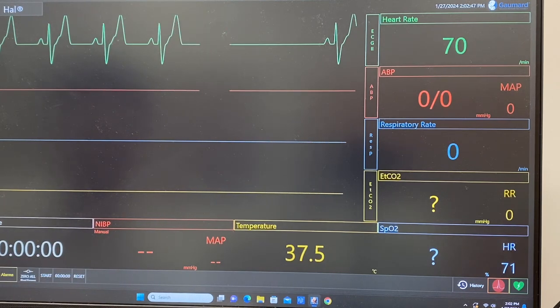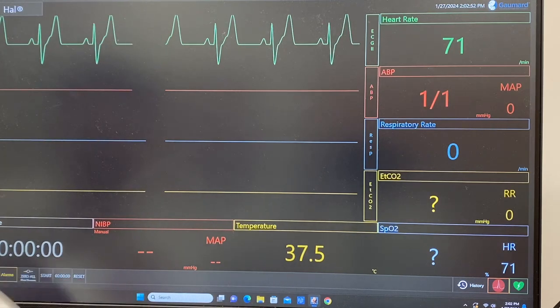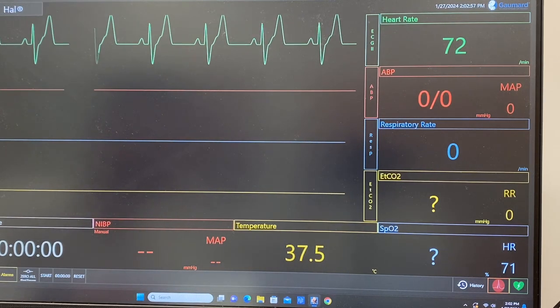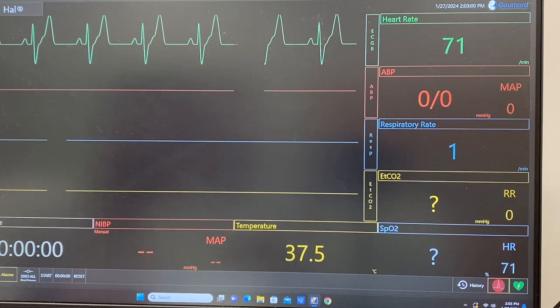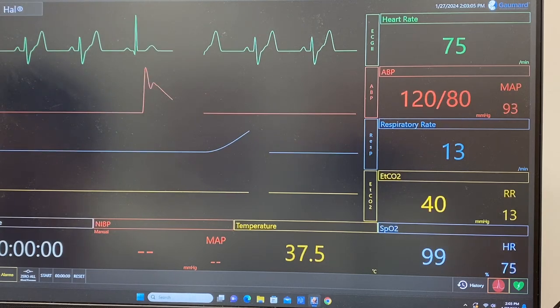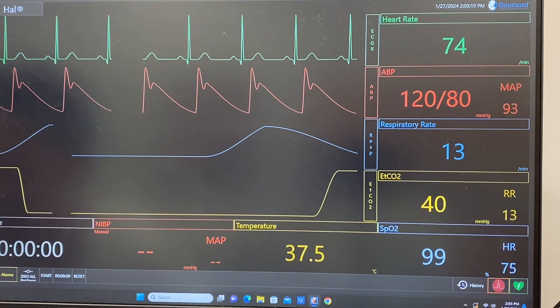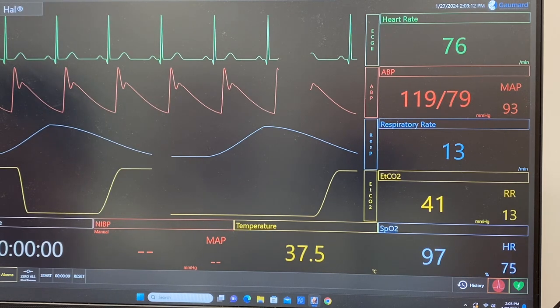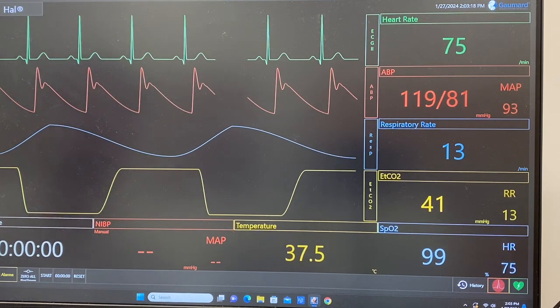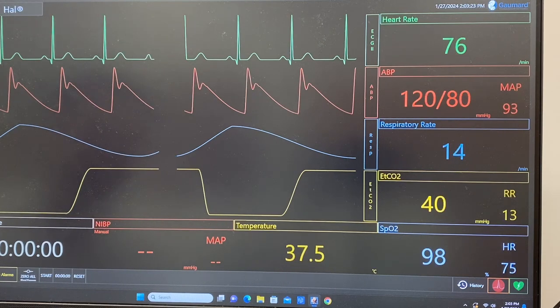Oh wait, I'm fine. It's going to say whenever we go with this patient, the patient died. Let me put a healthy patient first, because this one might die. Reset. Okay, put that back. This might throw you off a bit, but that's okay. It's going to be a teaching moment if ever. All right.